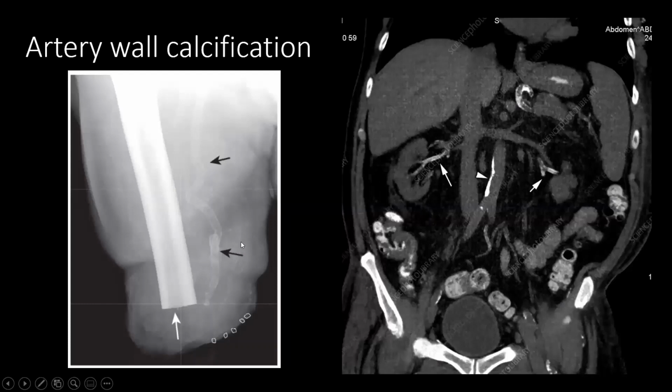Here we can see that this patient, this is the femur of the patient, and this femur is somehow cut, it's not continuous. So this patient has had an above knee amputation. This means this patient suffered from, for example, diabetes, and he had a gangrene, for example, or a diabetic foot complication, and they had to amputate his foot above his knee.